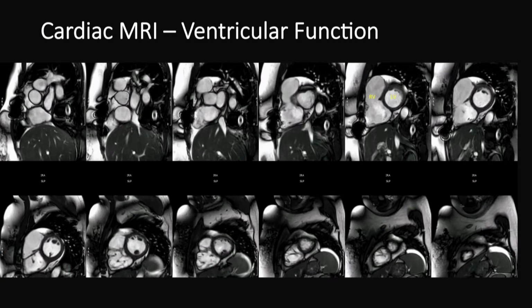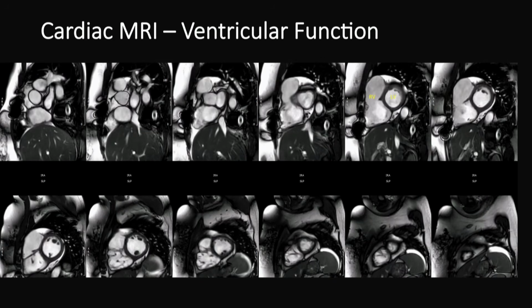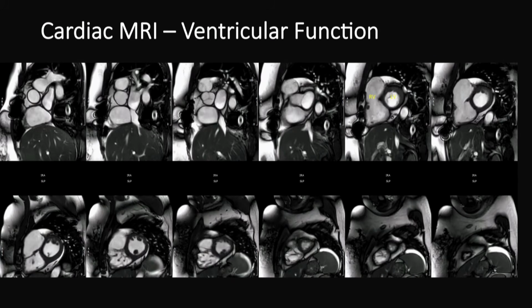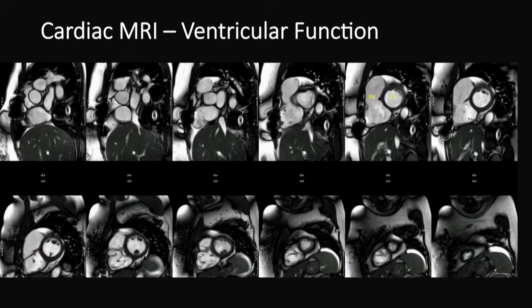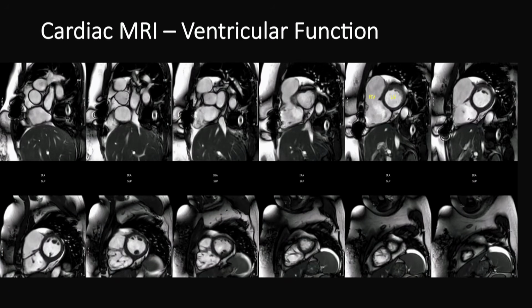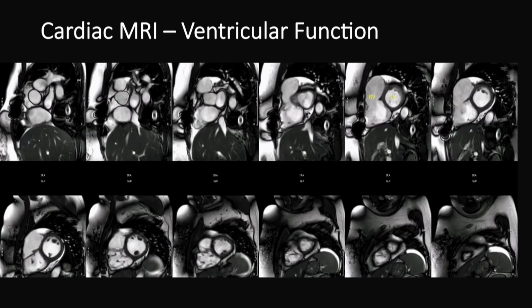And here I want to show you again. I would love to have a pointer, but if you help me, focus on the image where I label the LV and the RV, and look at the right ventricular wall and follow it up to the RVOT. You can see myocardium in the inferior part, but as you go up, there is an area at the top, the RVOT, where we don't see any muscle thickening.